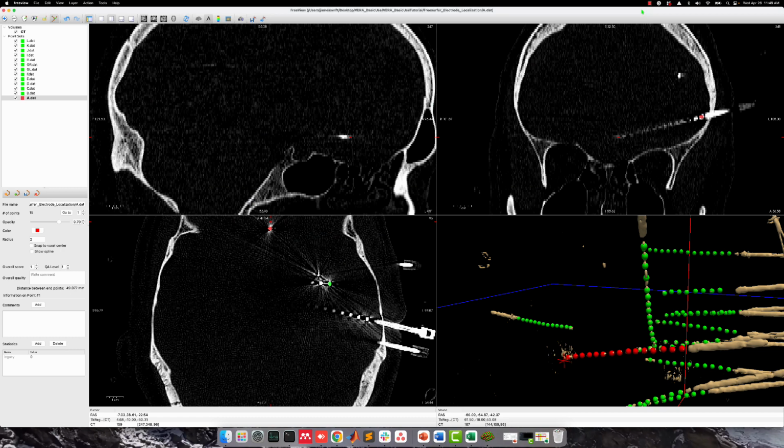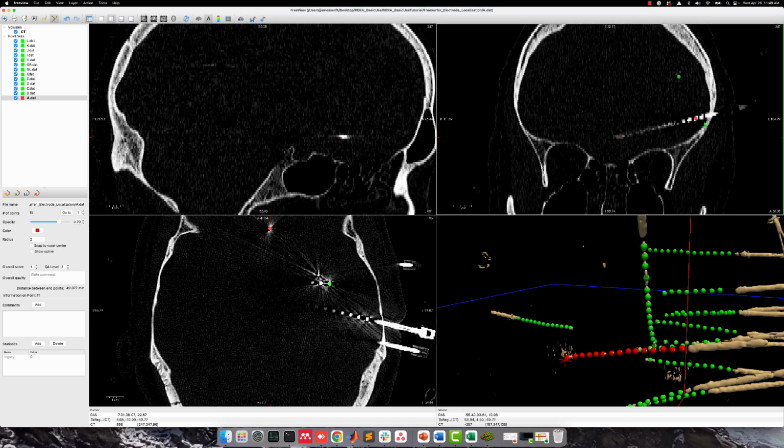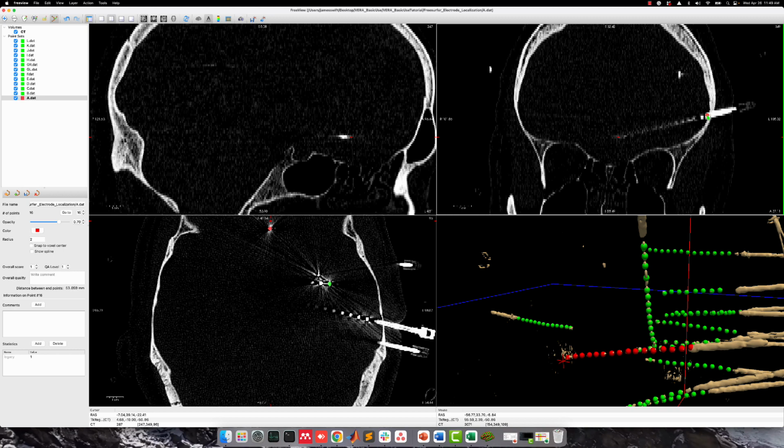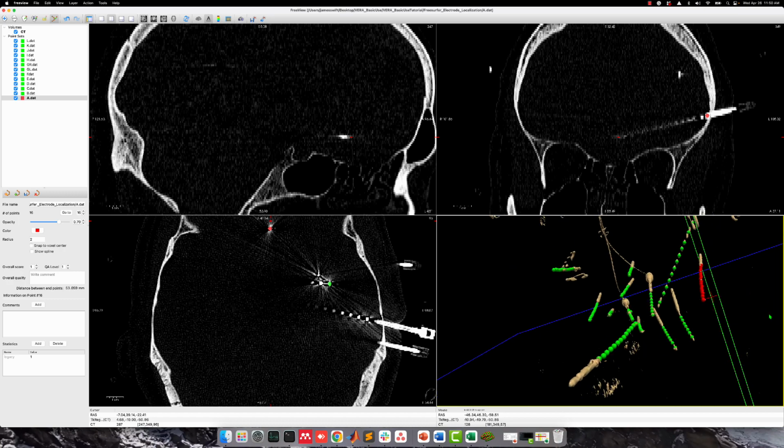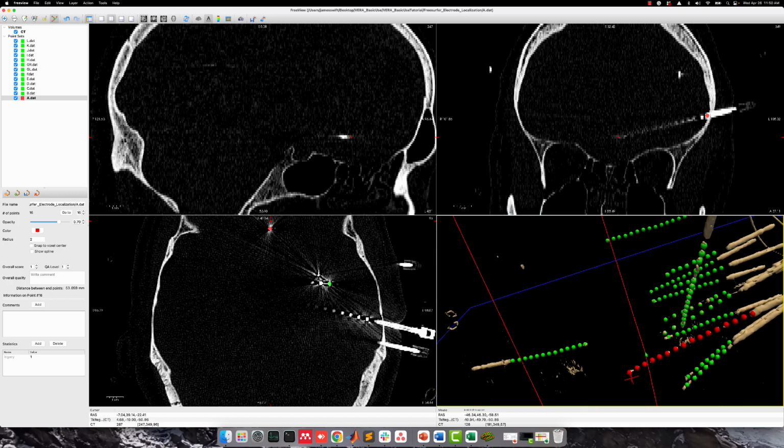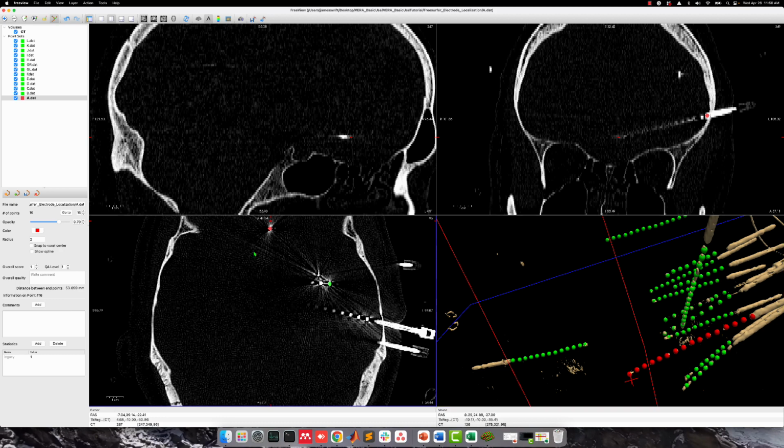Sometimes, electrodes are not implanted to their full depth, and some contacts are still inside of the bolt. I do my best to approximate the location of these electrodes anyway, with a plan to exclude them later in post-processing, because VERA is expecting the number of electrodes defined in the electrode definition. Save each electrode as you go to avoid losing progress.